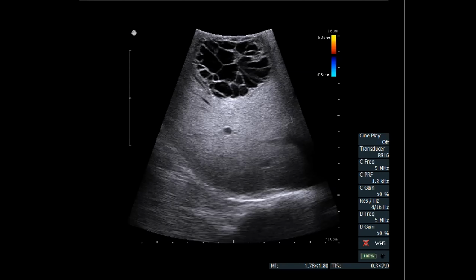Now I remember presenting a primary hepatic neuroendocrine tumor here last year or something like that, but that had more solid components in it. And when I looked through literature for hepatic neuroendocrine tumors, cystic neuroendocrine tumors, they did say one of the differentials can be hydatid cyst. And in fact, in that particular patient, I was super excited because we proposed prospectively that this would be a neuroendocrine tumor. They did a DOTATATE scan. The only area that lit up was the liver, nothing else, and that came out as well, and that was what it was. But in this case, this imaging appearance is so not like one.